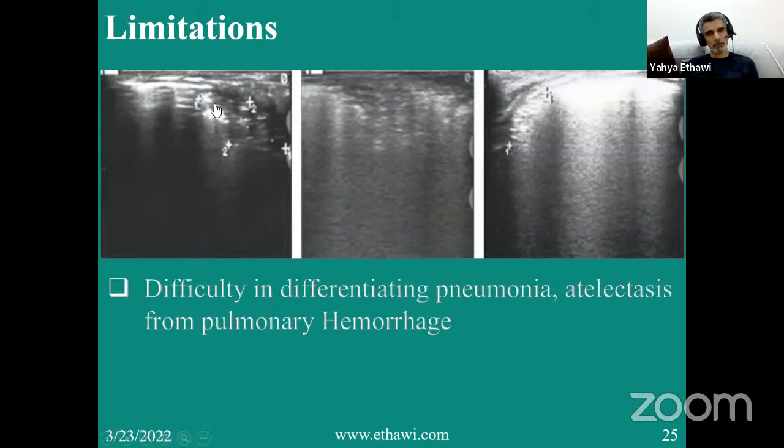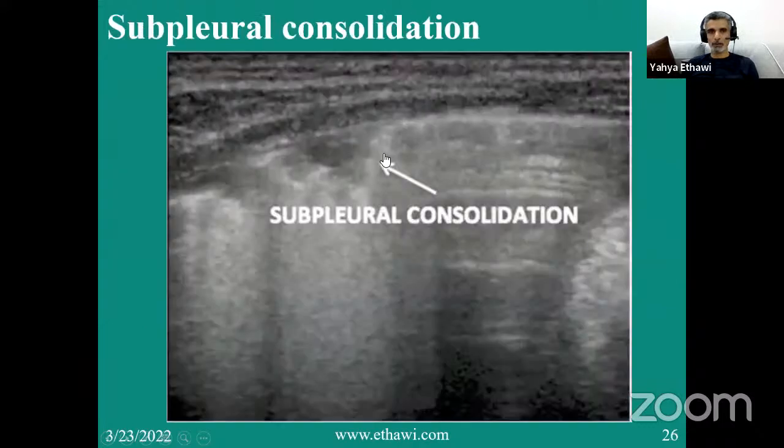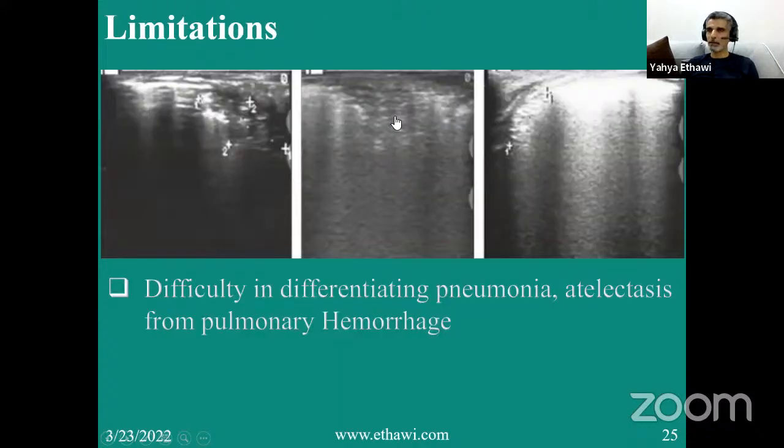In this picture, and this picture, and this picture, you can see that we are losing the pleura, or it's barely seen, but with some fluid. You can see that we're losing the B lines and A lines. Same here. This is more like chronic lung disease or pneumonia, or it can also be meconium aspiration. But this one is definitely not an infection because there are no boundaries.